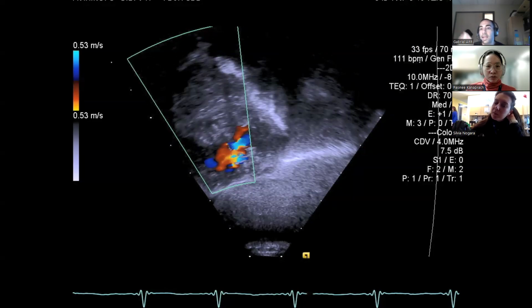So it's an easy way to rapidly screen if there's signs of pulmonary hypertension, right? Because if the gradient through a VSD is, I don't know, 65 millimeters of mercury, and your systemic blood pressure is 85, well, you know the systolic pulmonary arterial pressure is like 15 to 20. So you don't need a TR jet and spend hours trying to get one. Not hours, obviously, but it's quick, easy, and you get the information.